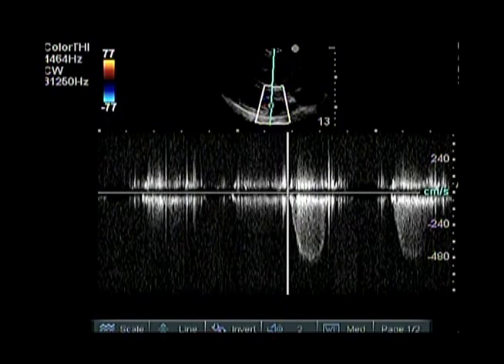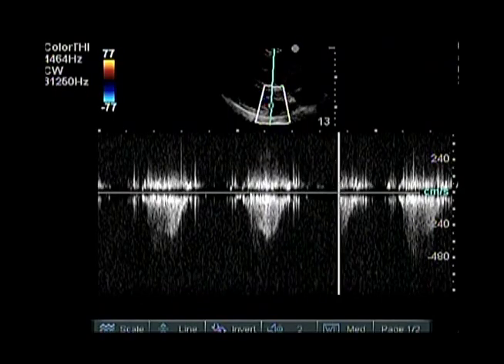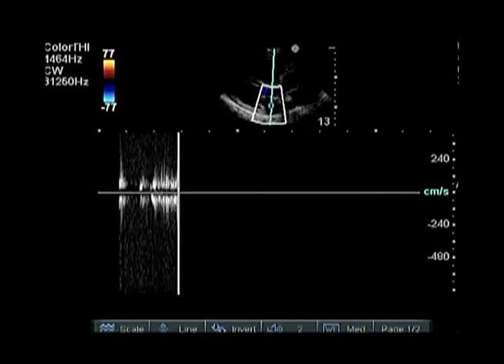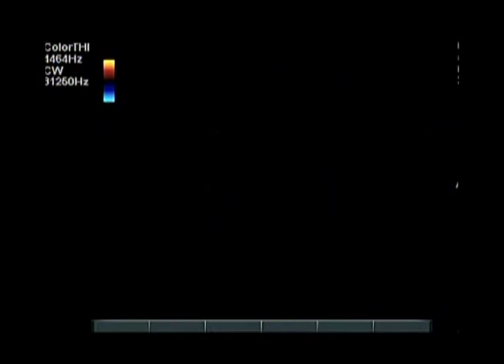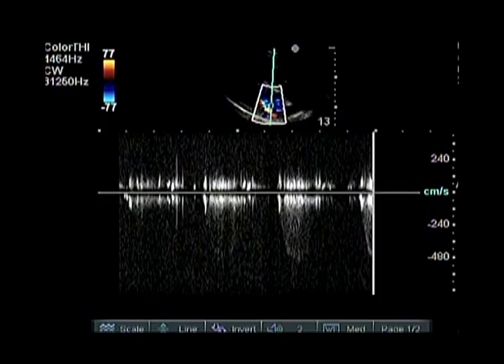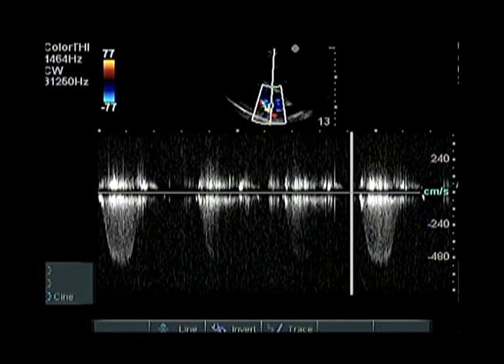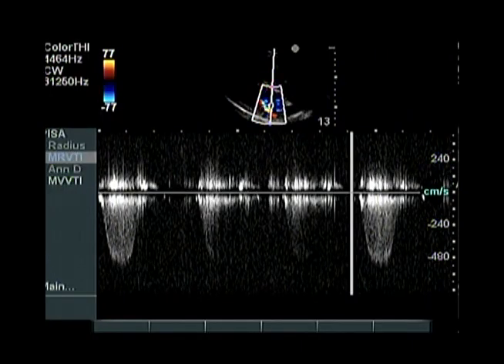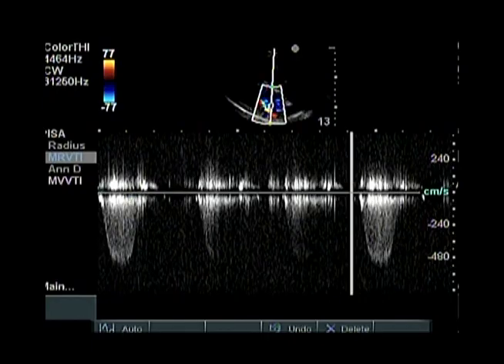Pressure gradients do not indicate the severity of valvular insufficiencies. The severity of valvular insufficiencies is judged by the increase in chamber size and depends on the volume of blood that is leaking. Spectral Doppler is not as helpful because small insufficiencies can have very high velocities, but result in the loss of a very small volume of blood flow and have no effect on chamber size. The pressure gradient can still be useful by indicating the pressure difference on both sides of the valve.